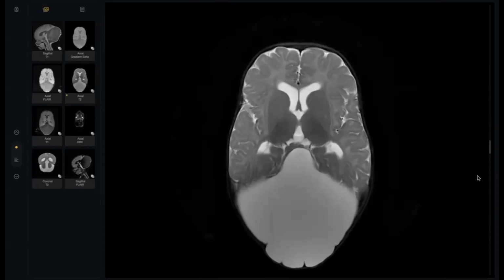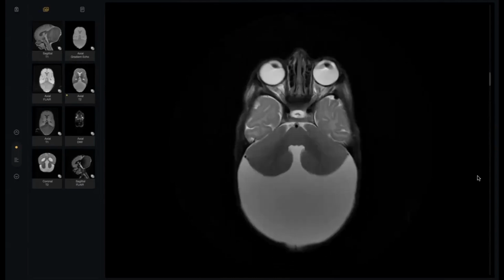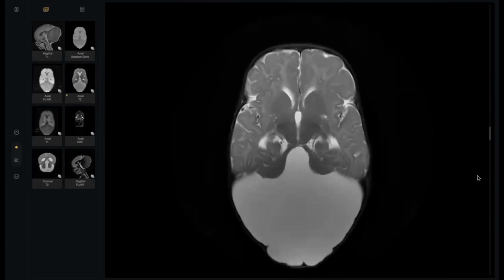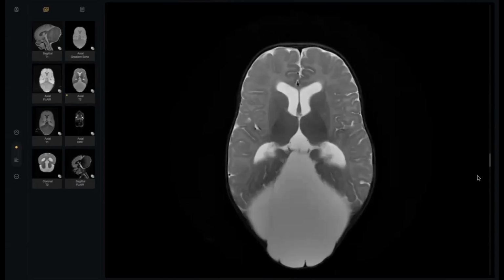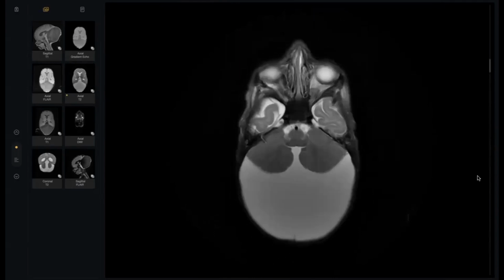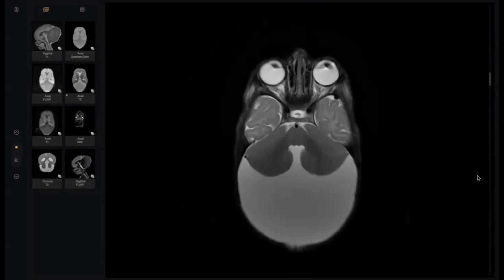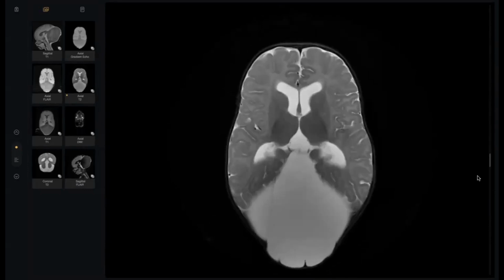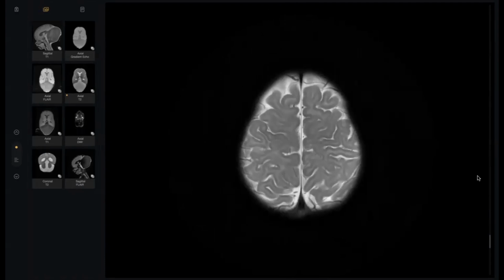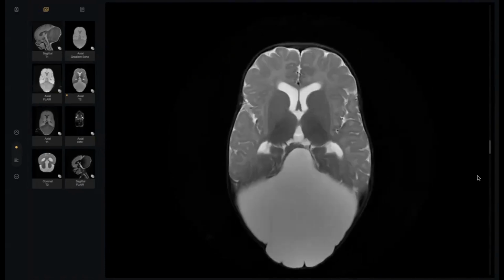Sir, again, I think it is stuck. Okay. This cystic lesion communicates with the fourth ventricle, and I cannot appreciate the midline vermis. I am also looking at the ventricular system. The rest of the ventricular system shows mild dilatation. There is no focal lesion in the supratentorial location.